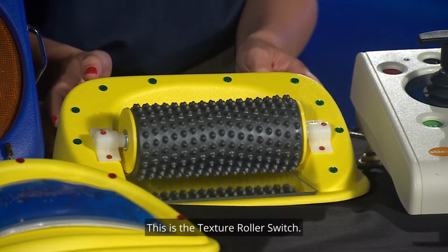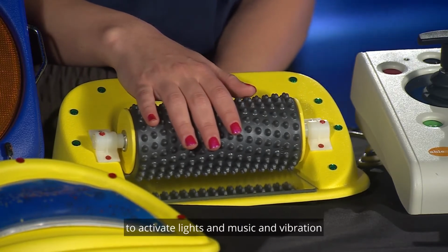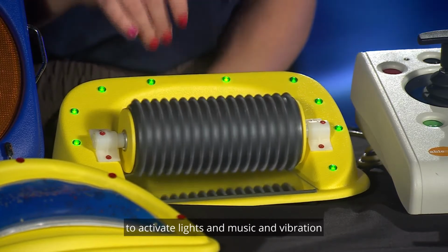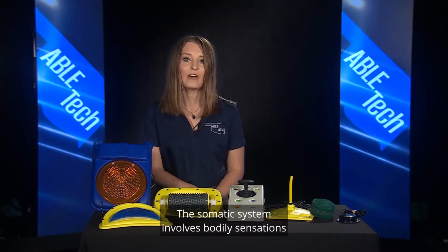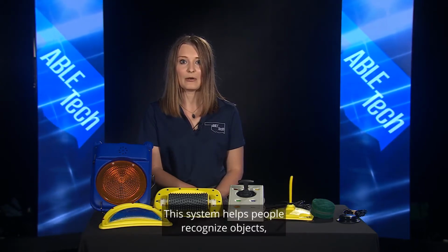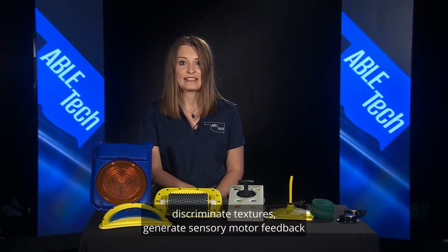This is the texture roller switch. Spin the roller switch's drum to activate lights and music, and vibration to enjoy a somatosensory experience. The somatic system involves bodily sensations of touch, pain, temperature, vibration, and proprioception. This system helps people recognize objects, discriminate textures, generate sensory motor feedback, and exchange social cues.